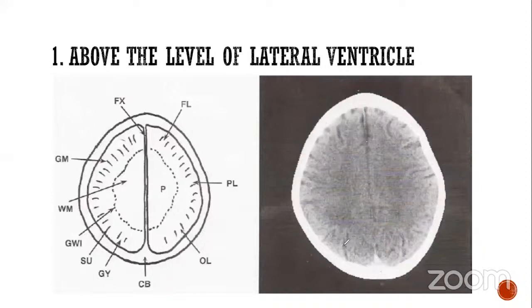Third one is sulci, the deeper portion, that is the groove, and gyri is the fold. That is the sulci, and this fold is gyri, and this groove is sulci. The sulci and gyri of the cerebral hemisphere are apparent because the CSF in the sulci is less dense than the brain tissue, and this makes the sulci darker than the gyri. That is the gyri, and that is the sulci. I will also give some schematic diagrams side by side.